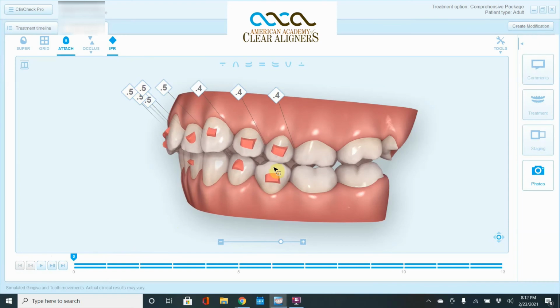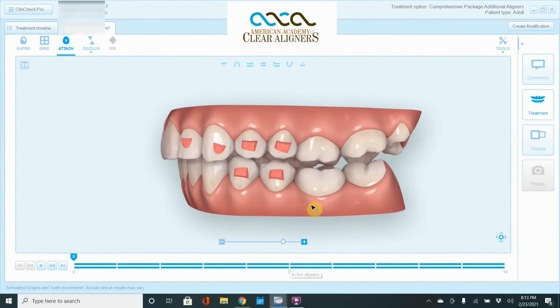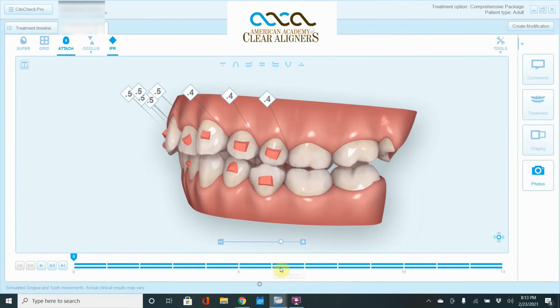What happens, though, is that you create some space here, and instead of the premolar distalizing, the molar can mesialize in something that we term iatrogenic mesial drift. This is this case 13 aligners later. Look what happened to the molar. It came to the mesial. Here was where it was supposed to be. See how the embrasures are completely lined up?